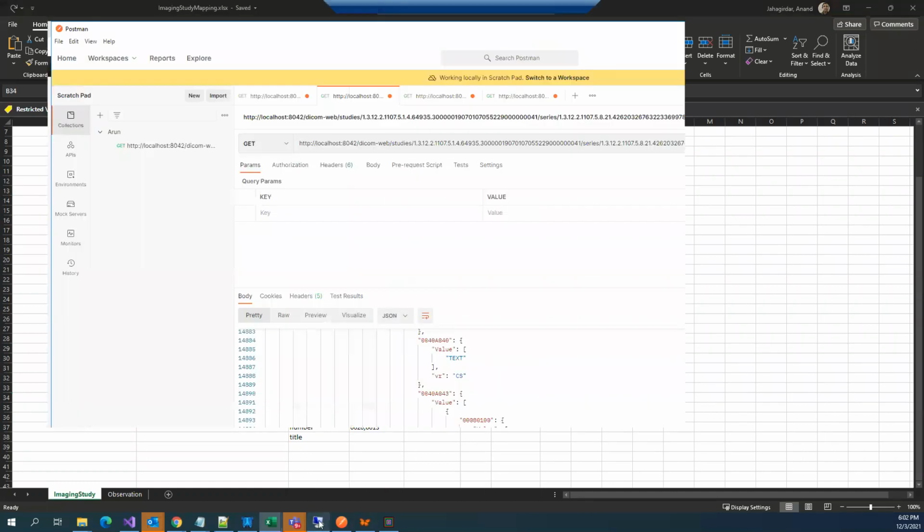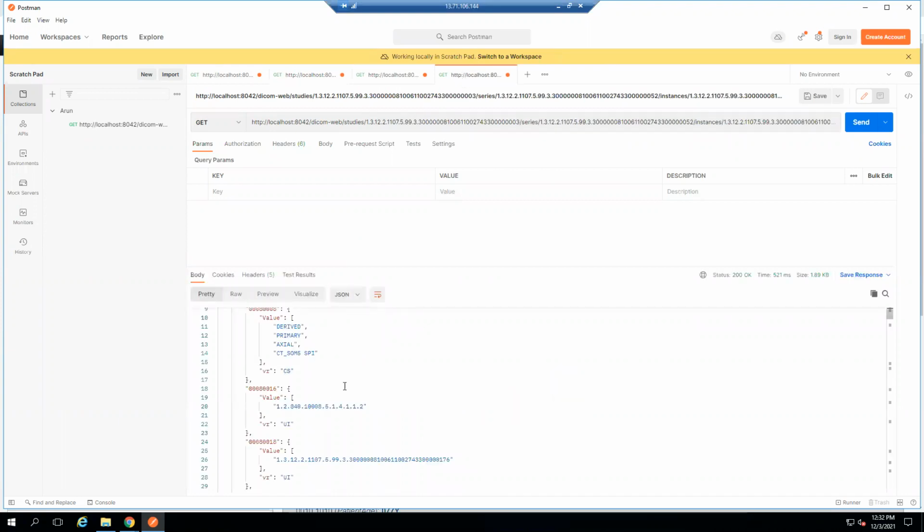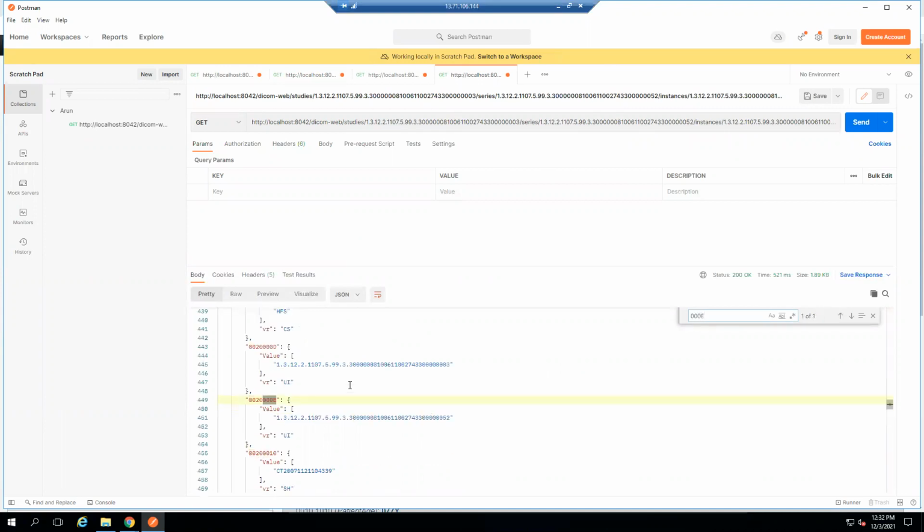And again, if I go back to this example, this is our series instance UID. In the JSON structure, if you want to put a JSON value corresponding to series instance UID, you take this slash value and put it in a template, then it will resolve into this.